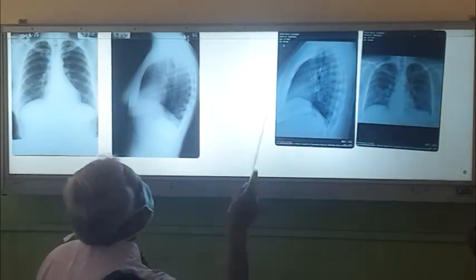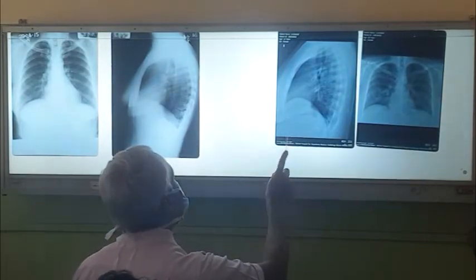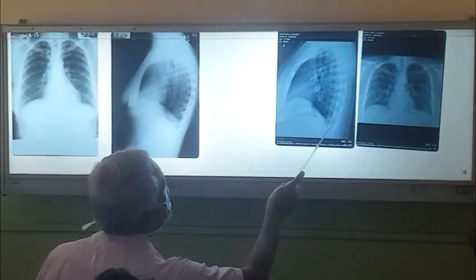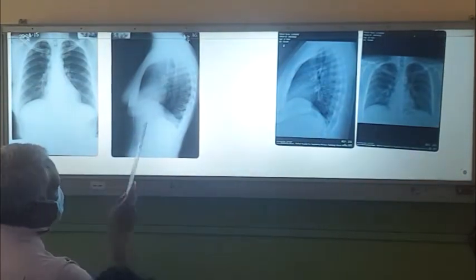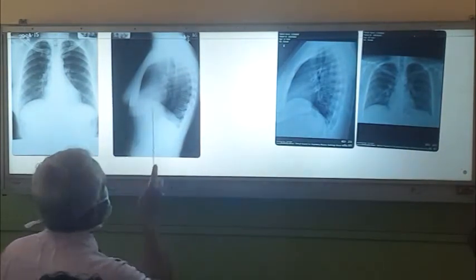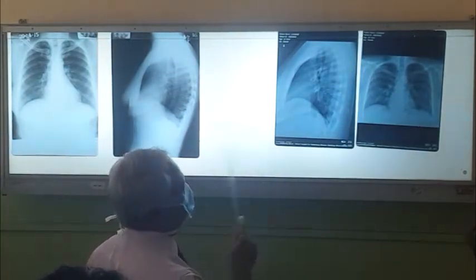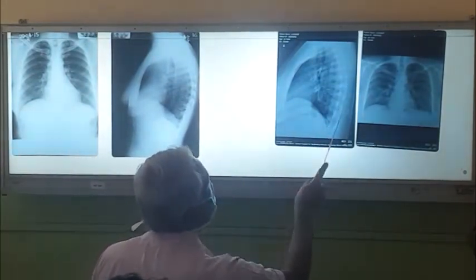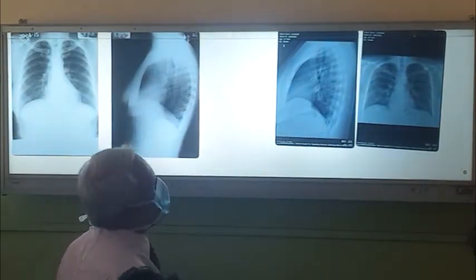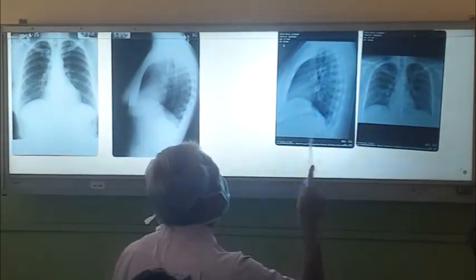Starting from the right, it is the right hemidiaphragm going up to the right side, and there is nothing above it. So you can trace it from this end to this end. On the left side you can't, because anteriorly you have the heart, so in the anterior one third you may not be able to see it in a lot of X-rays, right? So starting from here is the left hemidiaphragm. If there is a pleural effusion on the left side, you will see something like this. On the right side it is shown like this, right?